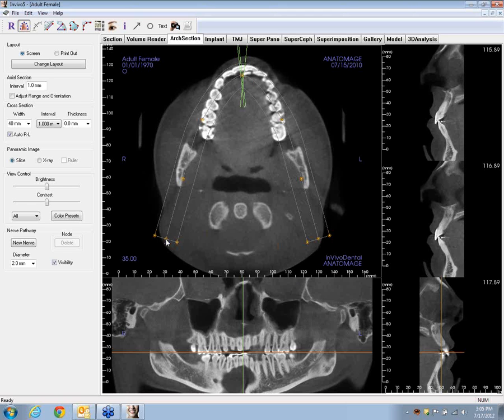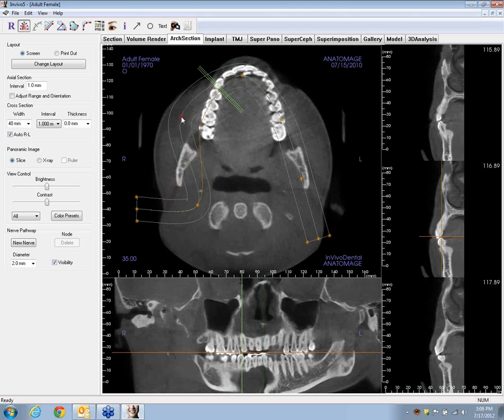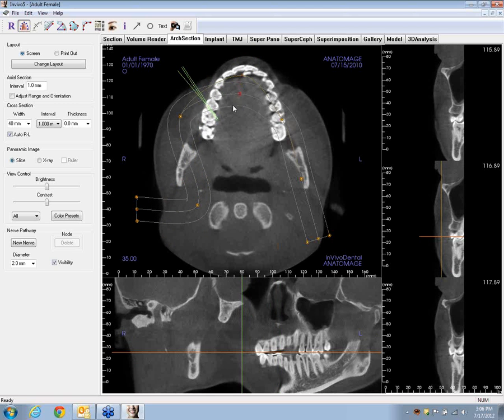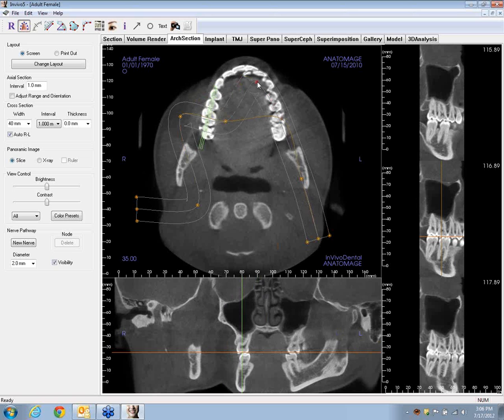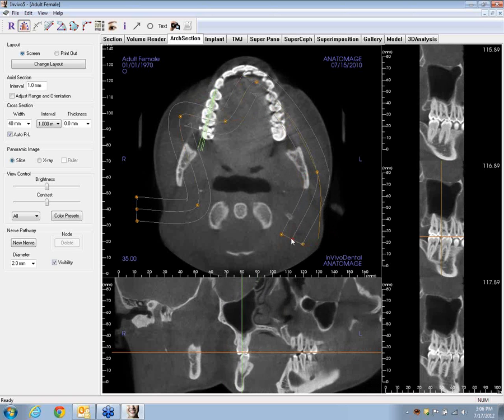And the whole point of this is that we are able to move these points to represent any space that we want to. We can move these spline points and define a completely new line. You can see this line follows a pretty weird pattern right now, but the whole point of this is that this view is showing you exactly what's going on here.